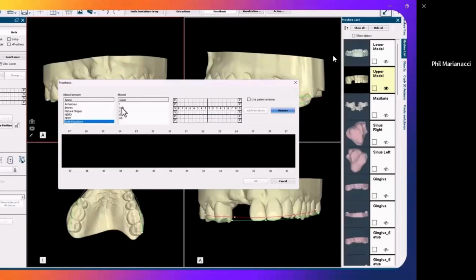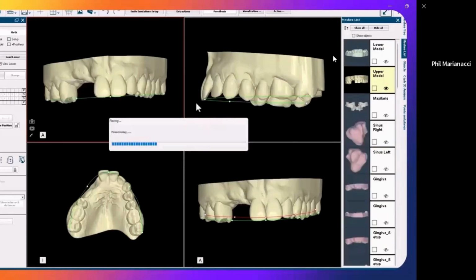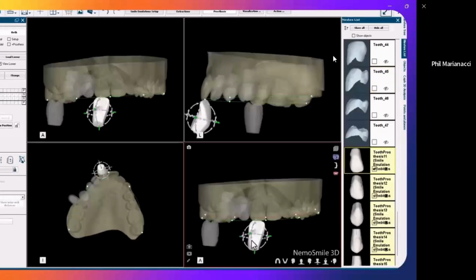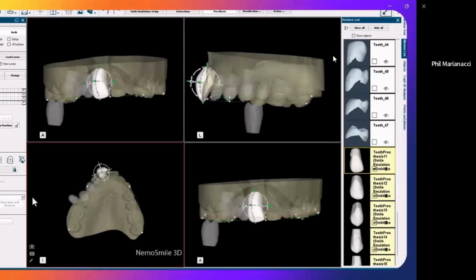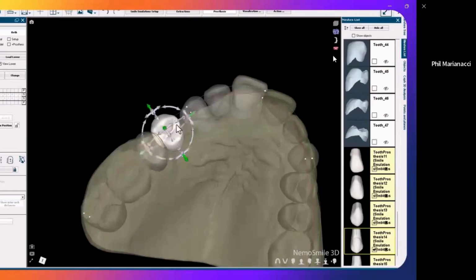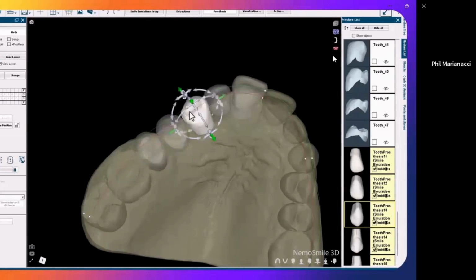So we're going to go to our smile emulations. We're going to go to 1MB, and we're going to select the teeth that we're looking to replace, and we're going to add those. So these are the previously created custom library based on the patient's actual morphology. We're going to click OK, and then Nemo is going to place those STL files basically into the mesh. And just move these into a more appropriate position. We'll just start moving some of these little tooth STLs more or less into the space, just for some preliminary conversation and assessment.